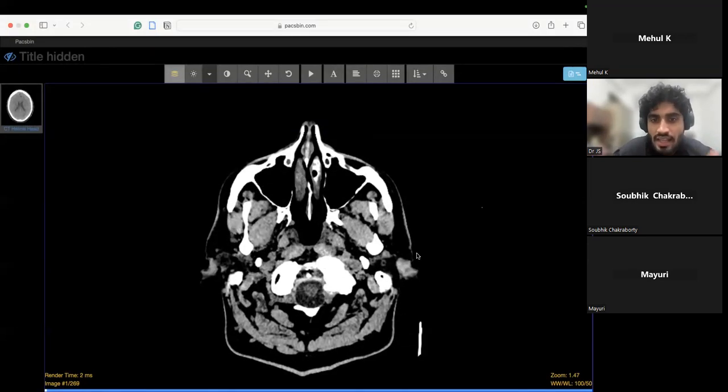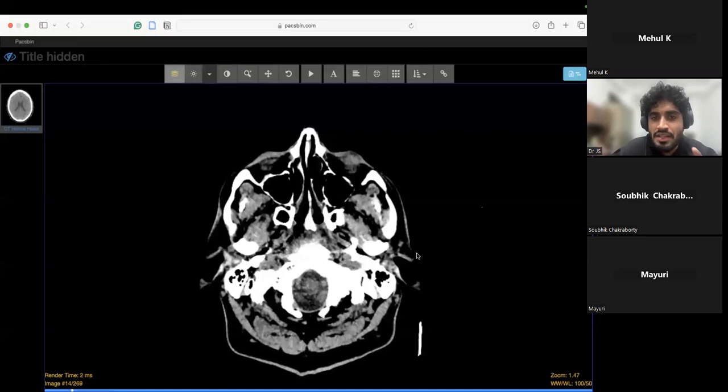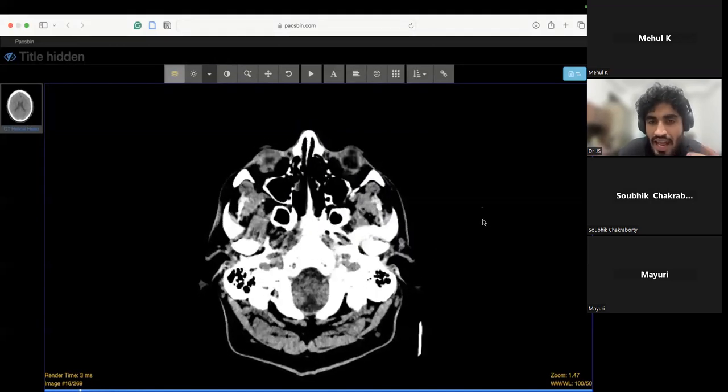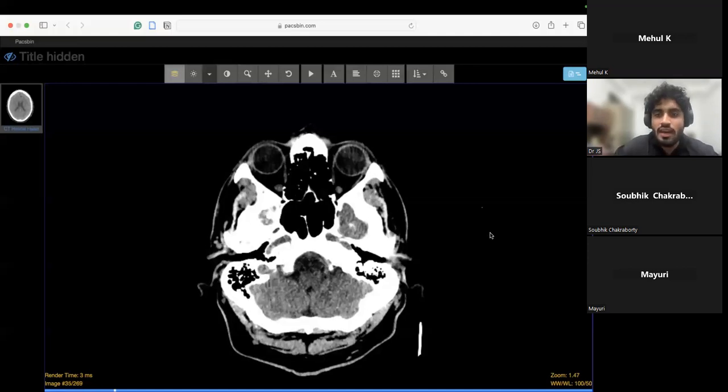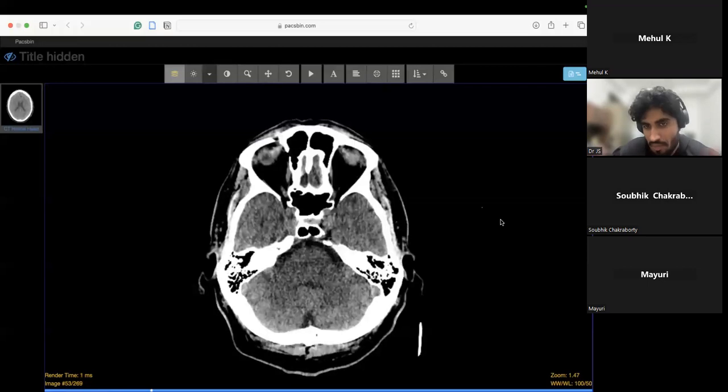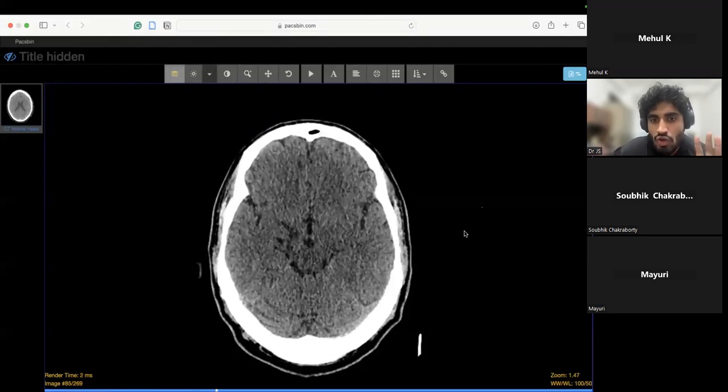Other than these internal herniations, if the patient has had any surgery, there can be transcalvarial herniation as well, where through the skull there can be a protrusion of brain. Okay, so you have understood, right?